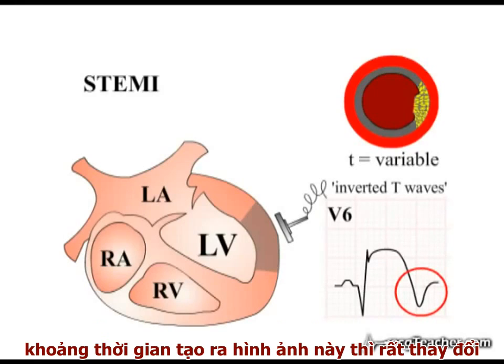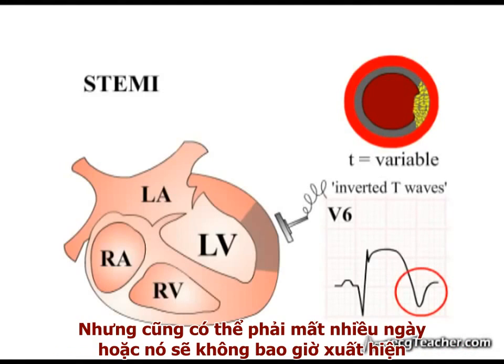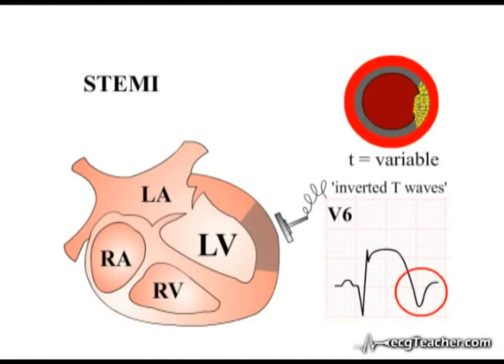The timing of this phenomenon is highly variable. It may occur early, in the hours following vessel occlusion, or may take days to develop, or may not occur at all. The mechanism underlying this change is controversial.